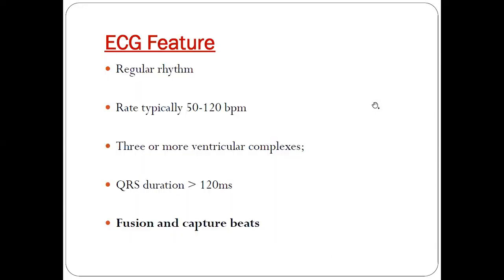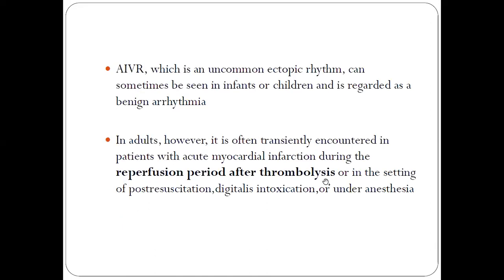Other than post-thrombolysis patients, this type of rhythm is also seen in patients post-resuscitation, with digitalis intoxication, or on anesthesia. It is also seen in athletes.